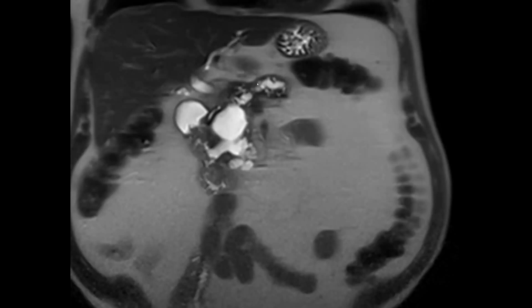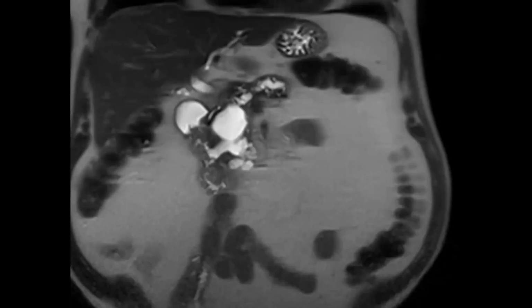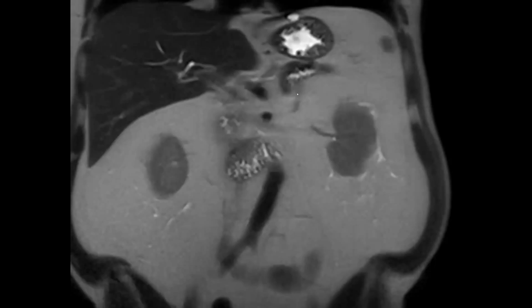The rest of the gland, what do you think about the rest of this gland? It's like ectatic, and the side branches are ectatic and prominent, dilated. Yeah, they are, but it's more like kind of ratty looking as opposed to really engorged, so this is actually more of a chronic pancreatitis picture. You can see that the gland is really dark and fibrotic here with these raggedy little side branches.